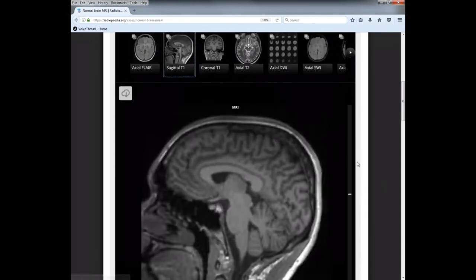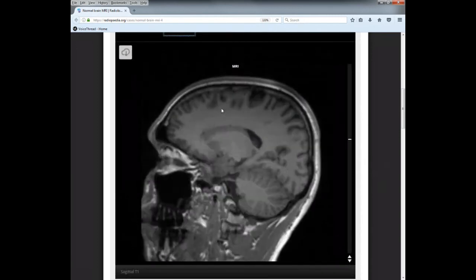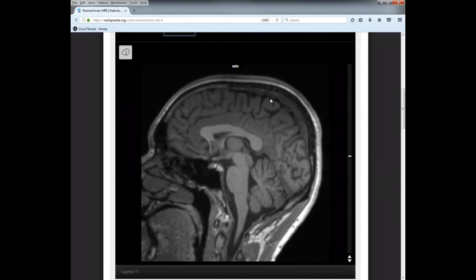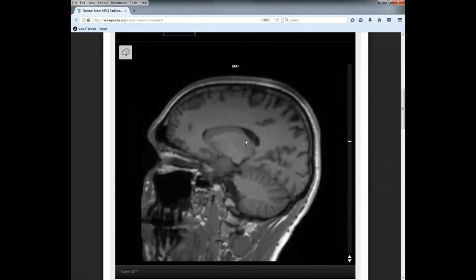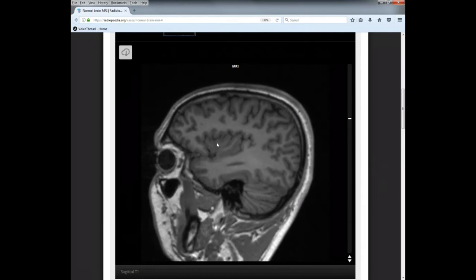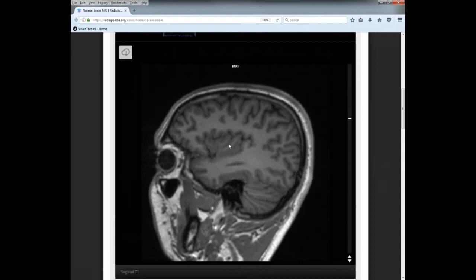In the sagittal view, as far as the lobes go, you have frontal lobe. Parietal is in here somewhere. This is probably the central sulcus right here. Frontal, parietal. This is definitely occipital, cerebellum here. And then we have to go out laterally to get to our temporal lobe. And then this guy in here is your insular lobe. Okay, that's kind of what we call, air quote, the 5th lobe right there.